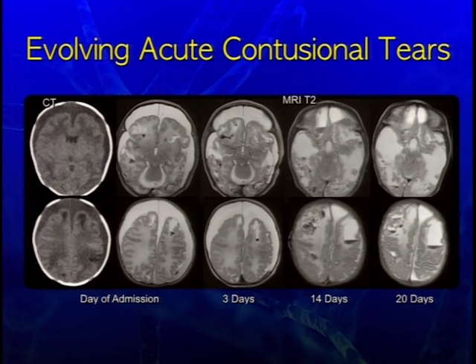You can see the extraaxial collections initially grow in size, and then we have these areas of CSF or parenchymal injury that evolved to become more CSF in their signal intensity. So areas that were clefts down here, you see growing of the clefts and essentially liquefaction of some of the areas of white matter. So throughout this time, there were no new diffusion signal abnormalities.